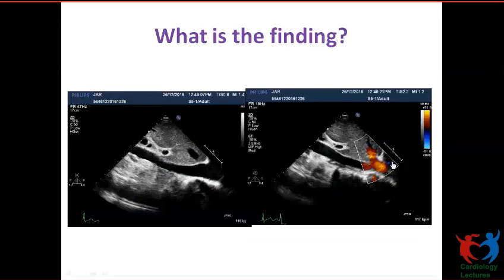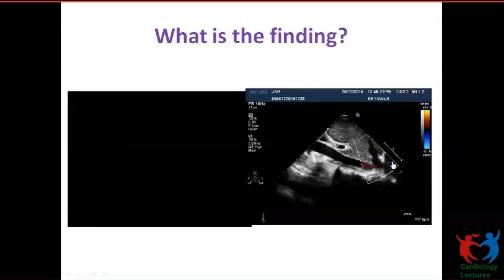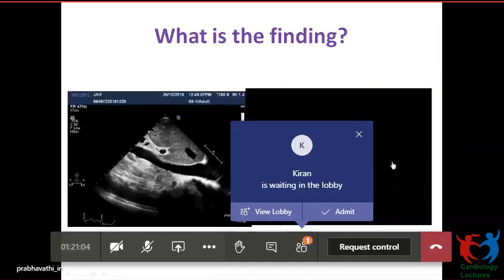Yes, ma'am. What is this structure and what do you find?